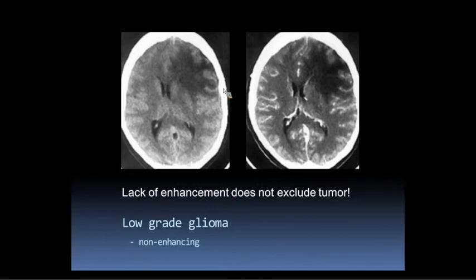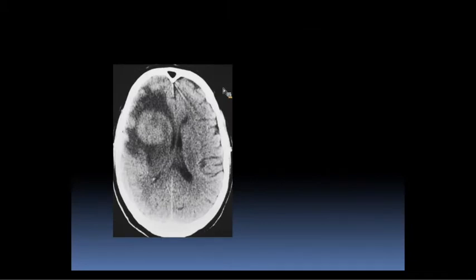Do you have to get an MRI just to make the diagnosis, or can you make that diagnosis based on that? You would get an MRI, but there's a lot you can see in the findings here. You would always get an MRI if the patient has a tumor, just because that's the standard of care. But there's a lot that you can get from the CT. And of course, there could be other findings on MR that don't show up.